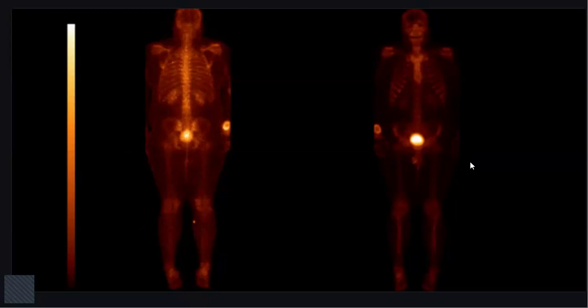On the posterior images there is a high index of suspicion of bilateral increased uptake in the tibia and fibula, in the legs bilaterally, having a tram-line appearance. These findings are nothing highly specific. The ribs are especially widened.